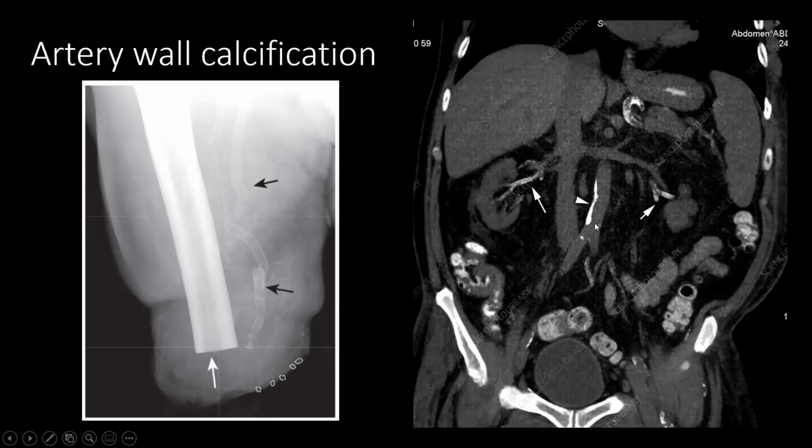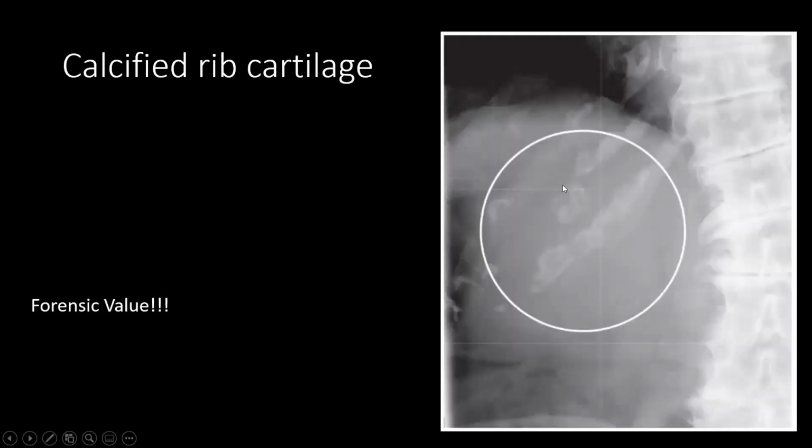Regardless of whether you can link things together, the main thing I want to say is that we have calcifications here in the arteries that are indicative of atherosclerosis, or this disease that has happened to the arteries. The appearance of this calcification in the aorta or any vessel, as being a tubular structure, is linear-like.